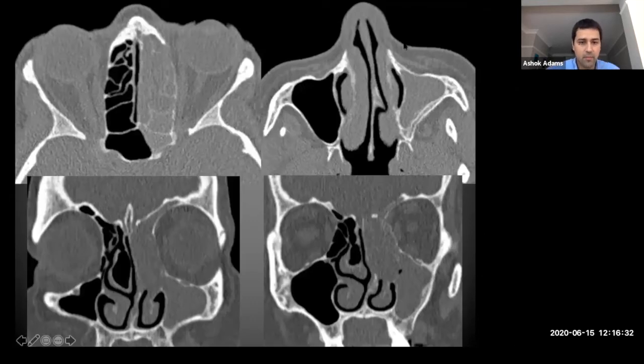So in this example, this patient was bouncing around with left-sided nasal obstruction, and you can see quite clearly that you've got a pan opacification here of the frontal and posterior ethmoidal labyrinth. You can see here frontal sinus, maxillary sinus, sphenoid. So you've got a unilateral pattern of sinus opacification. On the right side, completely pristine, with a little turbinate variant there, concha bullosa. So is this suspicious? Yes, because it's unilateral. And then I'm going to look at the bones.